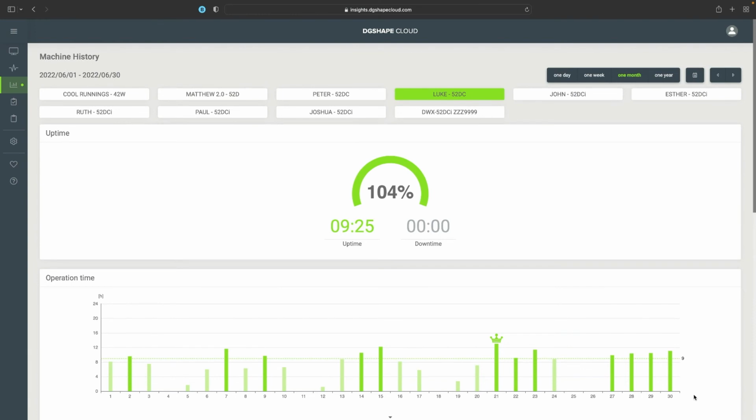Using the Machine History panel to manage your milling center provides the information necessary to optimize production. You can see whether your devices are being used efficiently and decide to rebalance the workload on multiple devices, or understand which time your mills are normally available and send additional work when production demand increases. You can also keep track of the items that cause downtime and take action to prevent them from reoccurring.